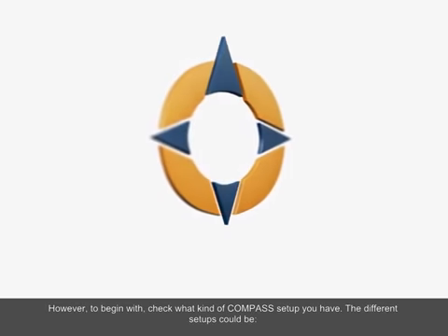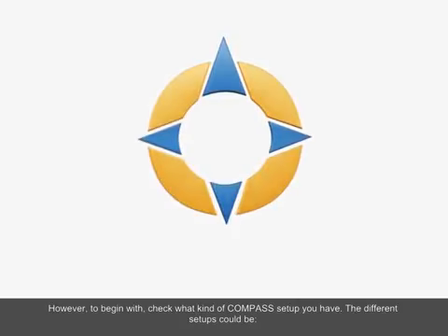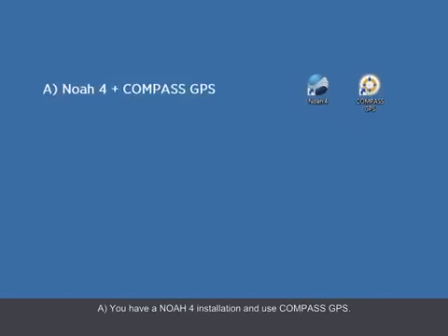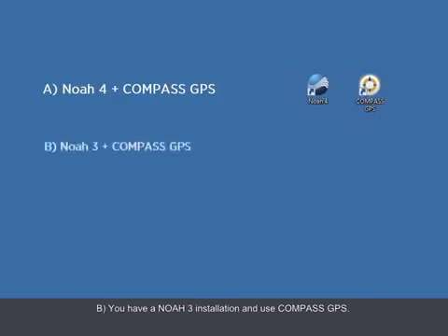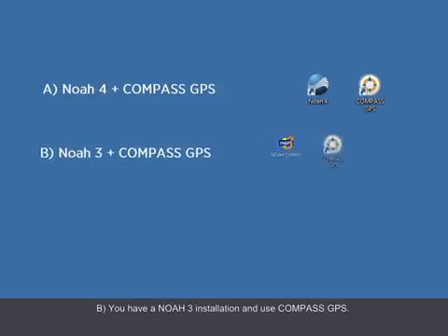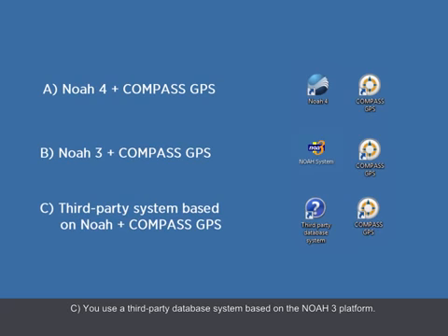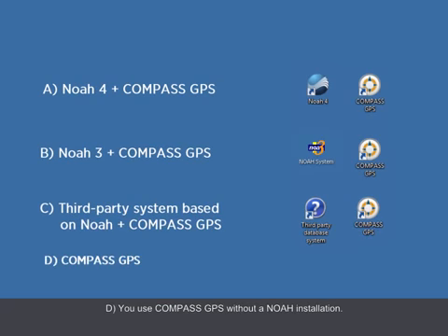However, to begin with, check what kind of Compass setup you have. The different setups could be: A. You have a NOAH 4 installation and use Compass GPS. B. You have a NOAH 3 installation and you use Compass GPS. C. You use a third-party database system based on the NOAH 3 platform. D. You use Compass GPS without a NOAH installation.